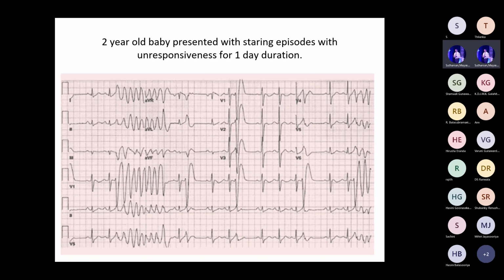What is this? So anyway, the QRS complexes are abnormal. What is the striking feature compared to the QRS complexes earlier? Now within the same lead, the morphology is different. That means the morphology is different, and also the axis, the polarity. Polarity means some leads are mainly positive, some leads are negative, some are neutral, right?